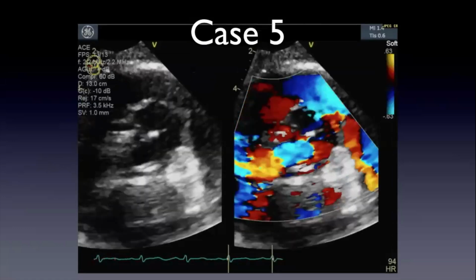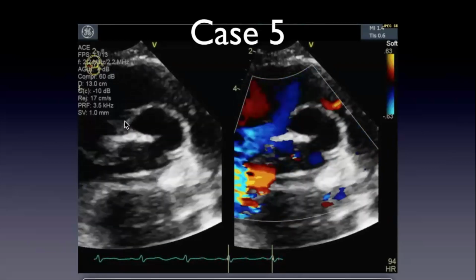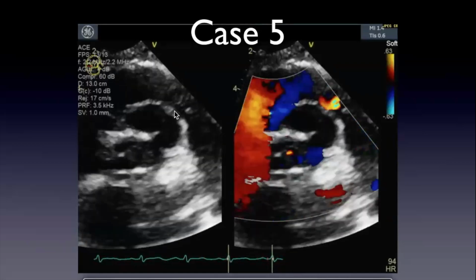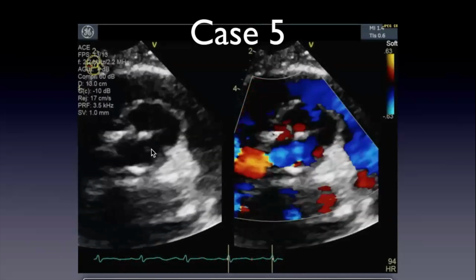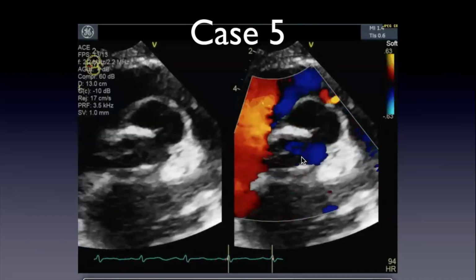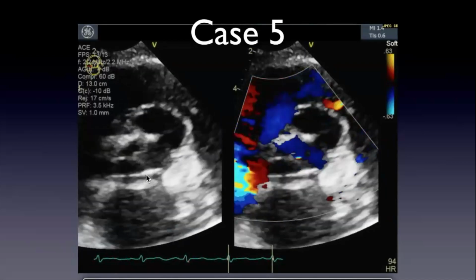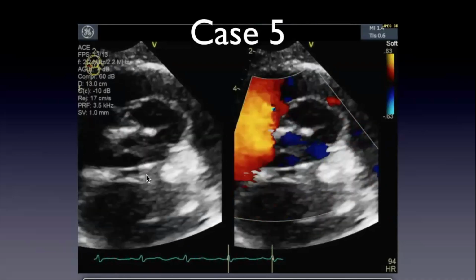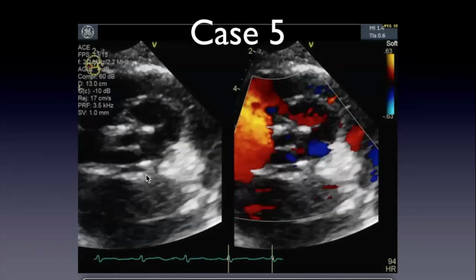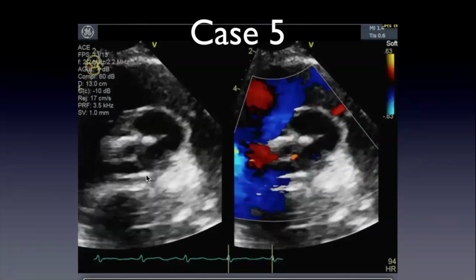So here it is on the short axis. Yeah, so you can see here it's a bit anterior and a bit lateral to the annulus of the aortic valve. It kind of looks like it's opening out for the aortic valve, right? Yeah, it looks like a cavity. And is there flow within the cavity? You can see a bit of pulmonic regurgitation. I don't see much flow inside. Yeah, nothing definitive, right? So the question is whether this is an old abscess cavity that got drained, and whether or not there's any communication of this cavity with the blood pool.